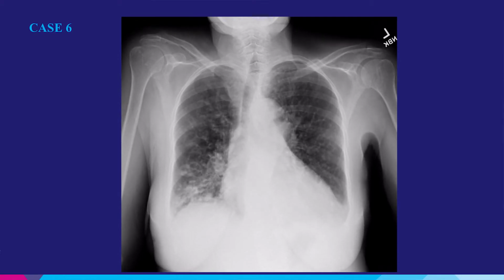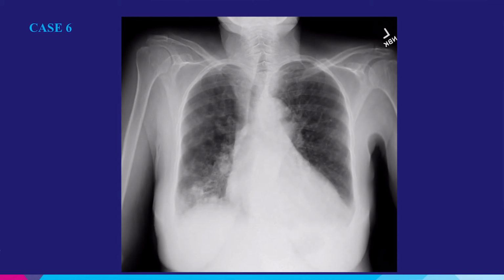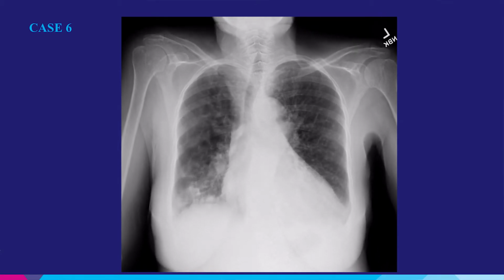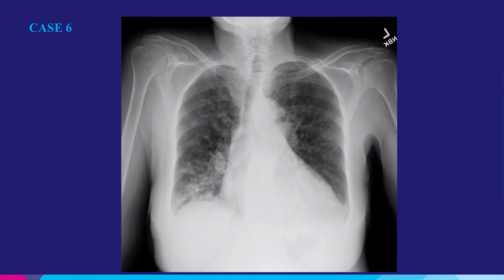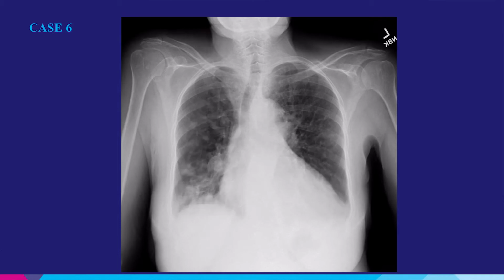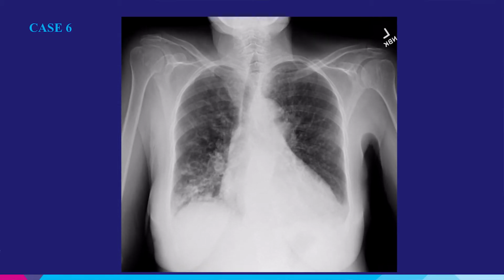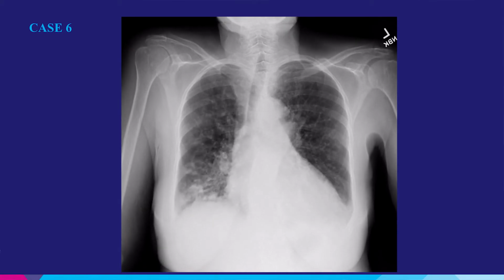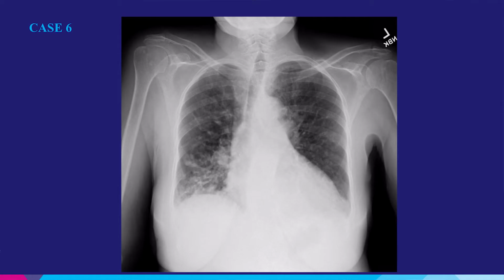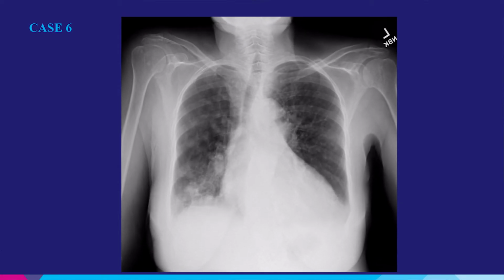This is not atelectasis. The other thing is we can follow these tubular structures here. You see the peribronchial cuffing. So you look at this tubular structure, and it goes all the way to the hilum. You can say, well, these are all dilated bronchi here. And then even this tubular shape opacity here, you can actually more definitively say this is probably an impacted bronchus as opposed to, let's say, atelectasis.